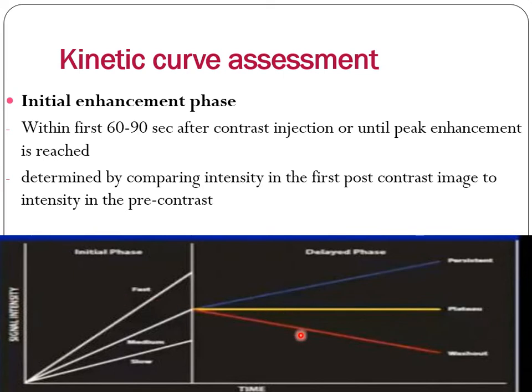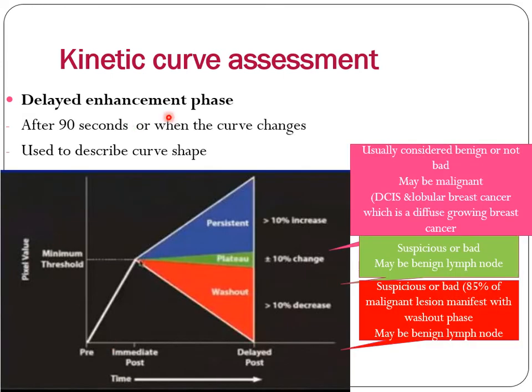And the delayed phase comes after the initial phase. I'll show you here, the delayed enhancement phase, after 90 seconds, a series of images are taken, from which a curve will be produced, as is shown here.